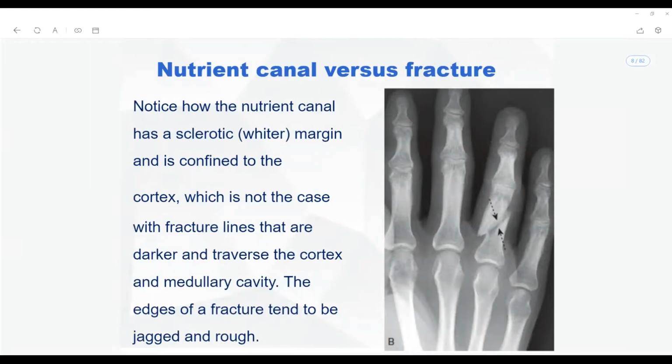This one is something like a big stone has fallen on his finger, or somebody hit that finger with a rod. When somebody is trying to hit, he is trying to protect himself with the finger. So a forceful, blunt injury has to happen, with a blunt object, generally a stone or a weight. That's fine. This is how I know it is a fracture.